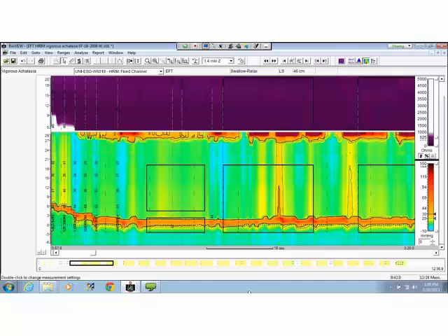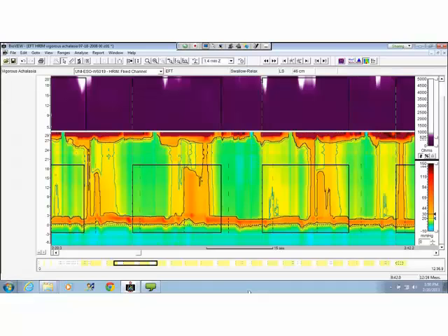Wendy? So, Wendy, are you saying then that you would measure on that lighter column? Not even on this lighter column. I don't see really any pressurization coming off of this striated muscle section at all. Okay, on some of the achalasia ones, when you have columns that are more prominent than this particular one, yes, like that.